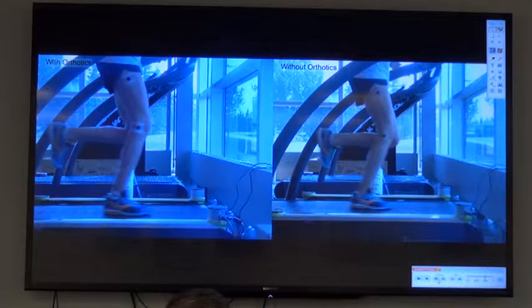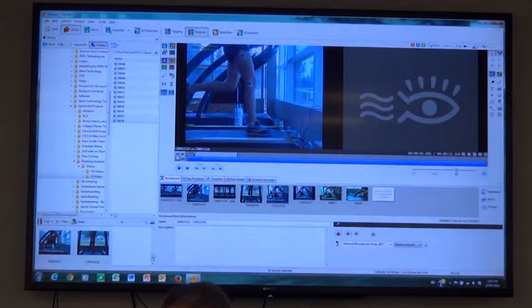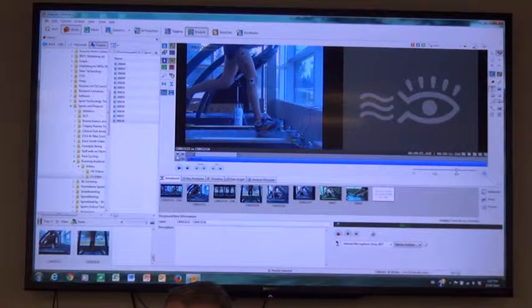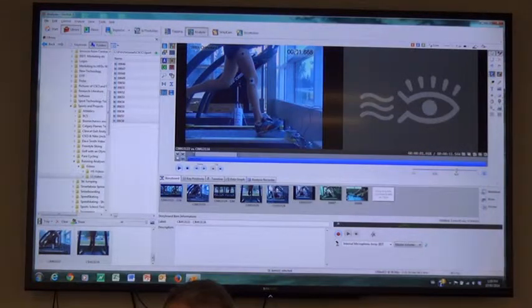So I would basically be looking at time-wise. So if I went back to right before her heel contact, another thing I would do is put a clock on here. Let's make this a little bit bigger. And I'm going to call this 0, okay?